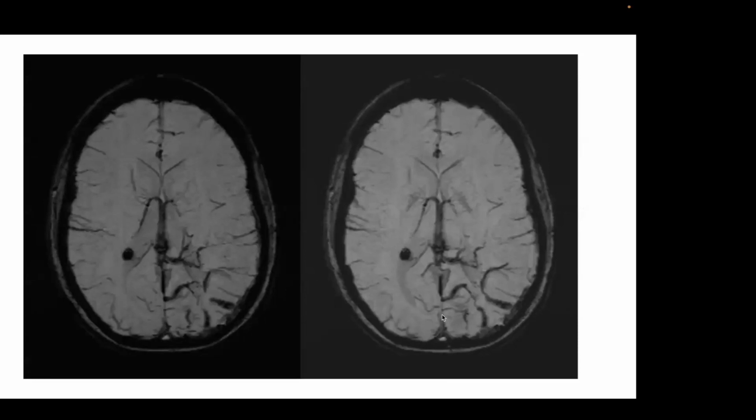And maybe not on this image, but if you look generally on SWI imaging, on some of the techniques that are used, oftentimes the arteries are bright and the veins are dark. So sometimes you can use SWI imaging to help you to determine if you're dealing with arterial flow or venous flow. And in a case like this, an MRA might have been helpful.